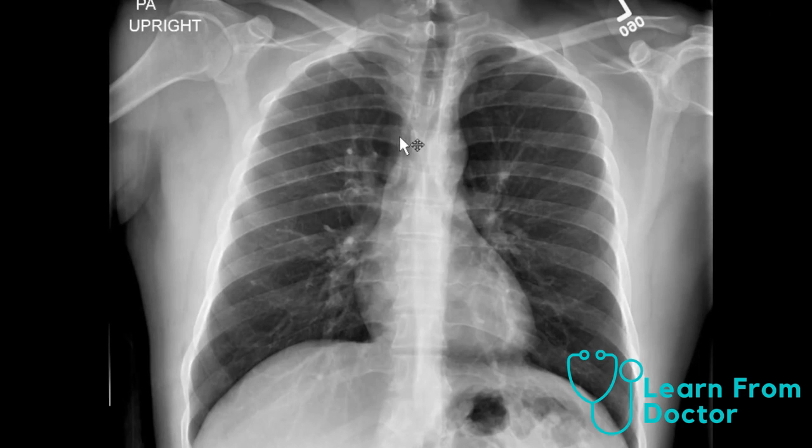What I do is I follow the right side of the mediastinal silhouette down, making sure there's no mediastinal widening. Follow this on down through my right heart border to make sure it's not obscured or silhouetted out by some consolidated opacity like a pneumonia. Again, I come down lower along my left heart border.